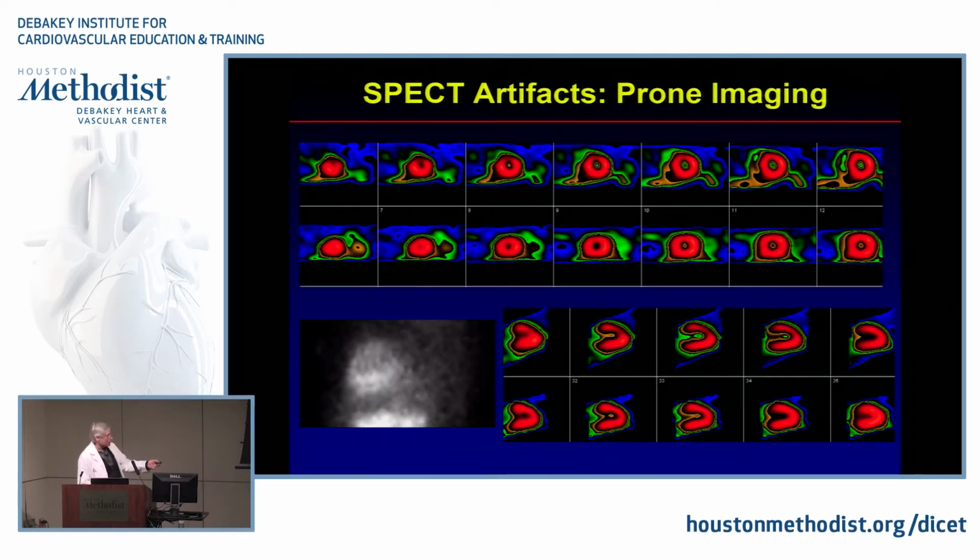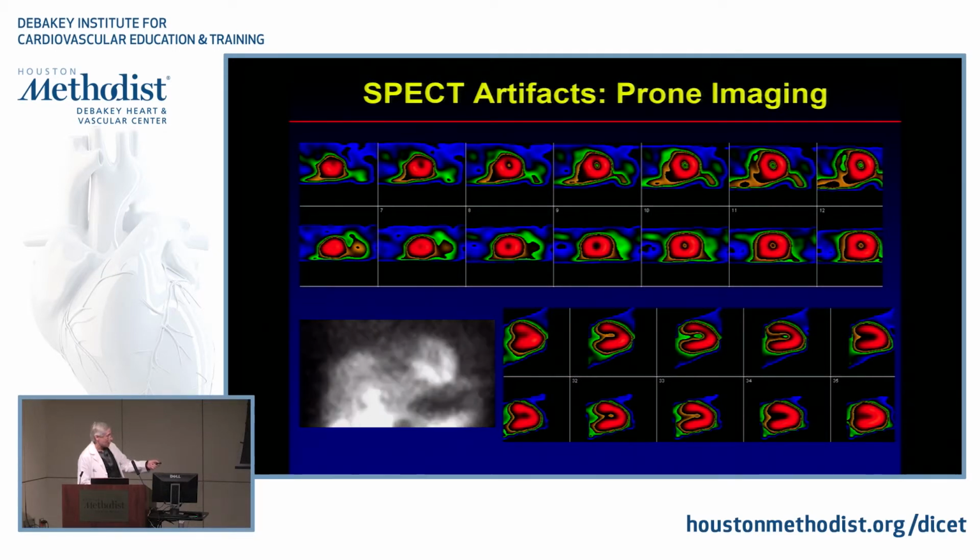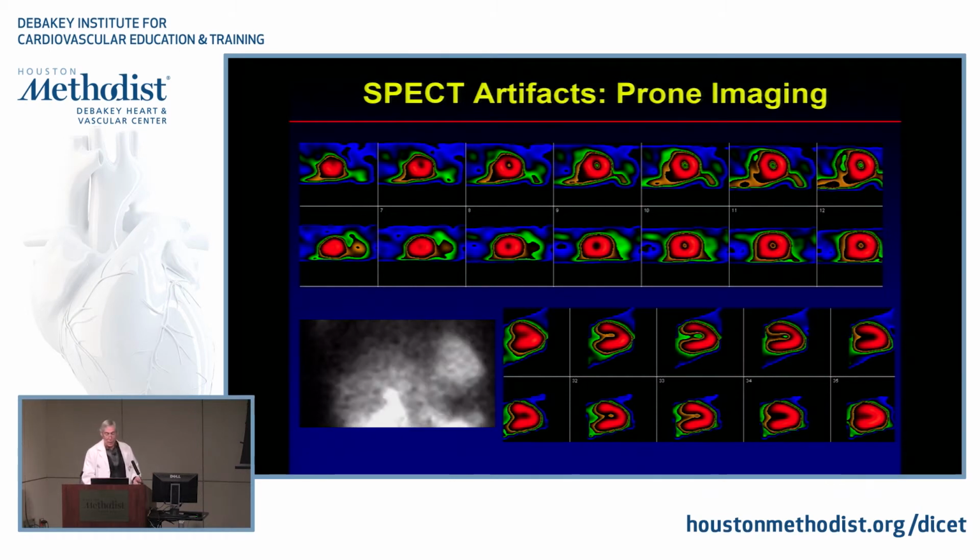So anyway, you can see there's breast attenuation here, right? You can see the breast shadow, how it is here in the breast shadow. So this patient looked as though this was probably breast attenuation.